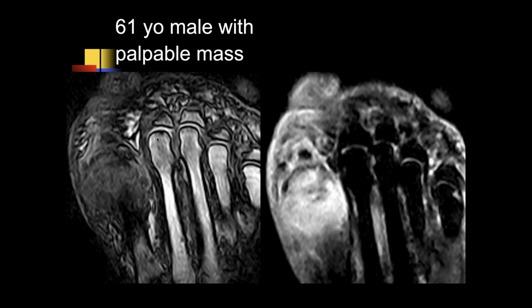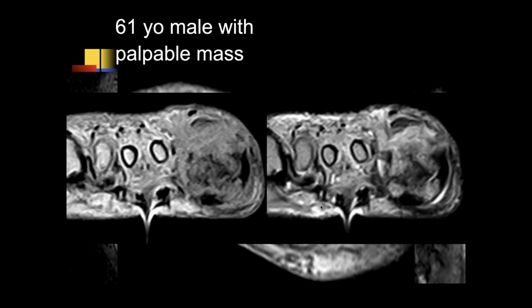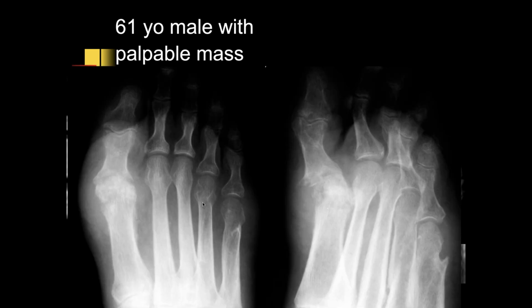Okay, so 61-year-old male with a palpable mass. We can see a large soft tissue signal intensity mass that's increased on STIR images, kind of throughout the first metatarsal head and neck. This could be like tophaceous gout with osseous destruction. Extensive destruction there of that first metatarsal head.